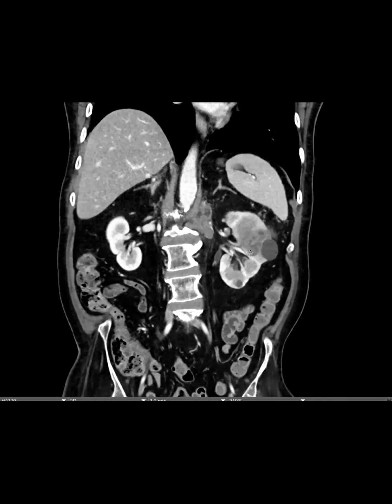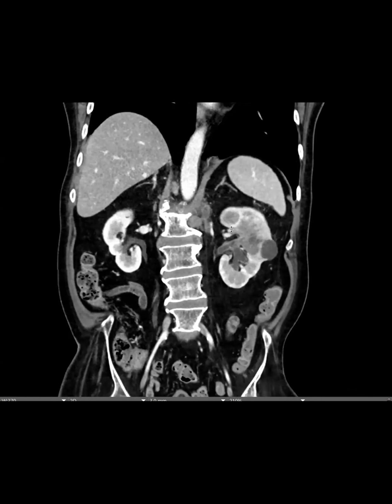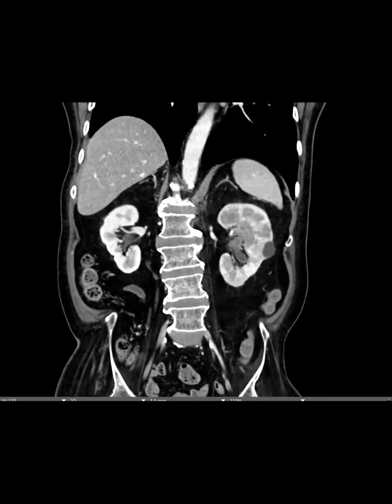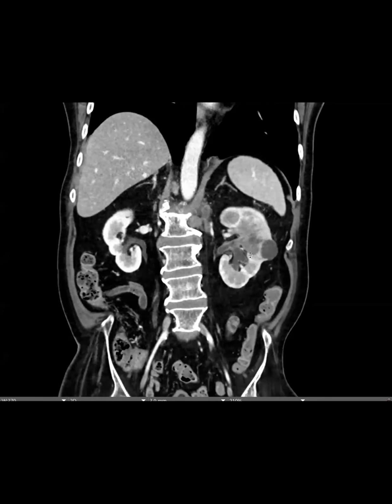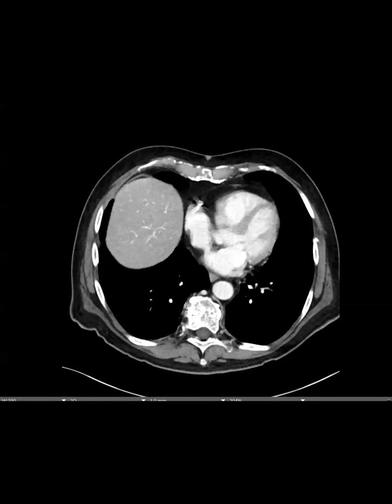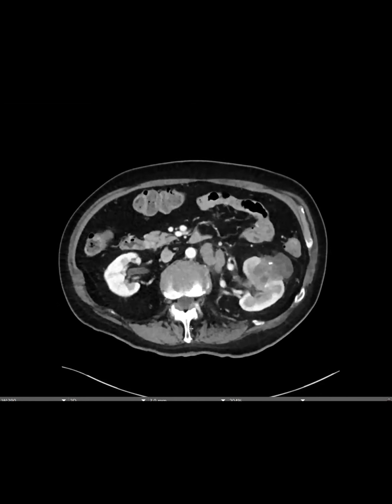You know, this is why surveillance is important, because there's tumor in the vein right there. Really, if I saw this de novo, I would still put urothelial in the differential. Yes, exactly right. This looks like a UCC, right? It looks like TCCs lately. The last one of the cases in my last two GU tumor boards was one where I would probably have said incorrectly that I favor an infiltrative TCC or a renal TCC over an RCC, and it was an RCC.